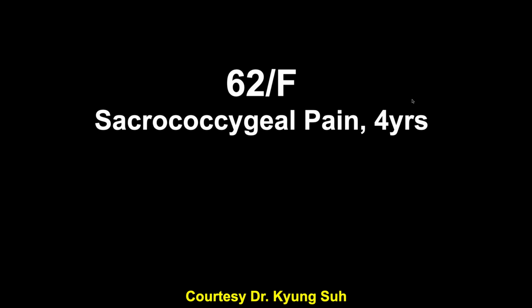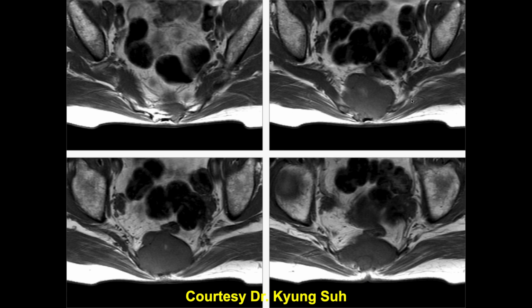Okay, let's go on to the next category of notochord type tumors. Here's a 62-year-old female with sacrococcygeal pain for 4 years.